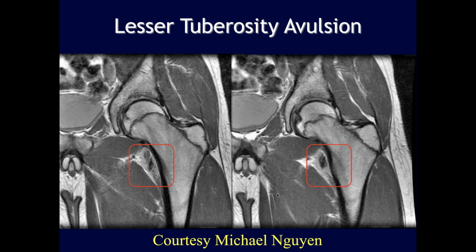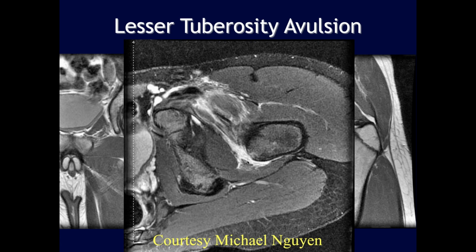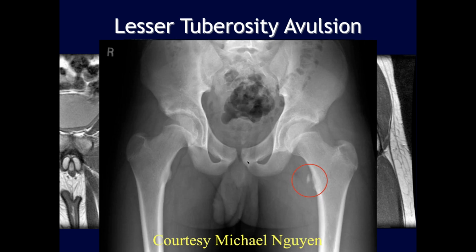An avulsion, right? Avulsion injury. And what attaches there? That'd be the psoas, iliopsoas tendon, right? And there's where it attaches, and there's where it's been avulsed off here. Separation right there. That's the epiphysis. Yeah. There's what it looks like on the plain film. Good.